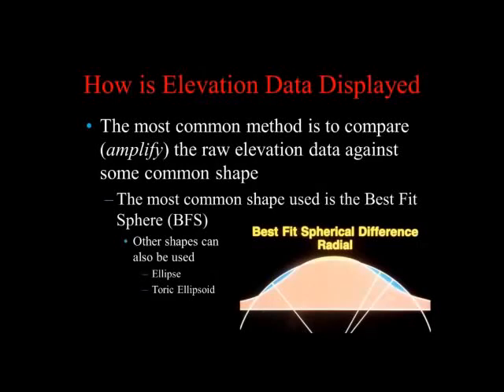So we already kind of went over some of this, but again, to show you elevation, I want to stress again that the reference surface is there for a visual inspection. It doesn't affect accuracy. The computer uses raw elevation data. But again, it's there to amplify the raw elevation data to allow us to make very easy, intuitive understanding of what's going on in the eye.